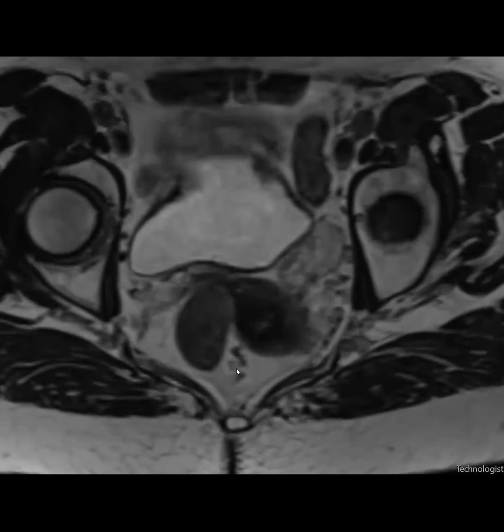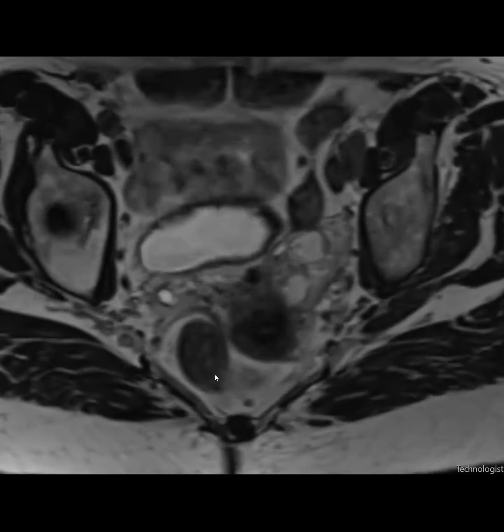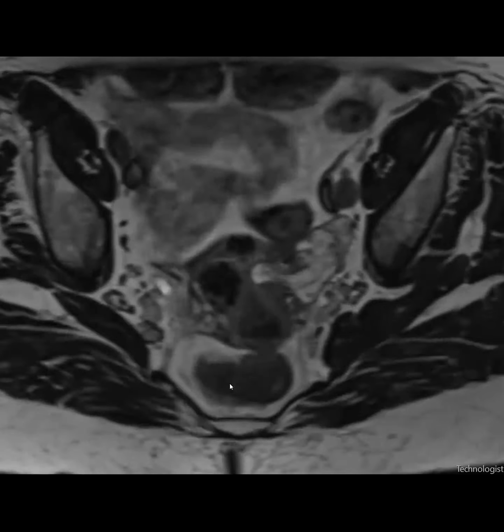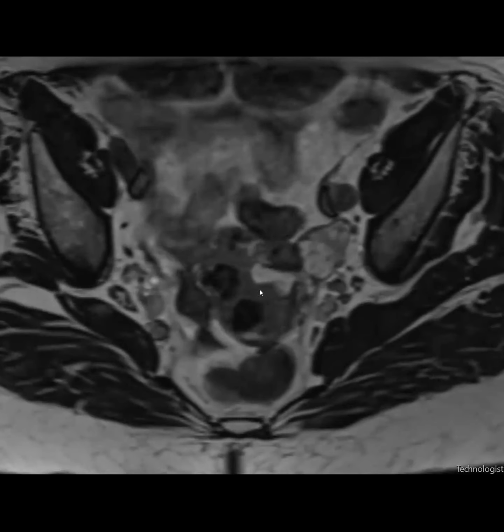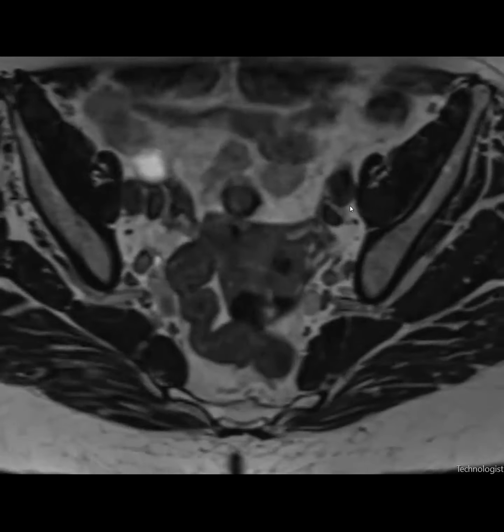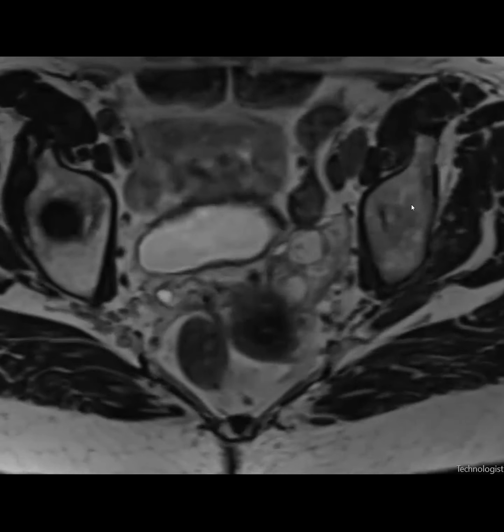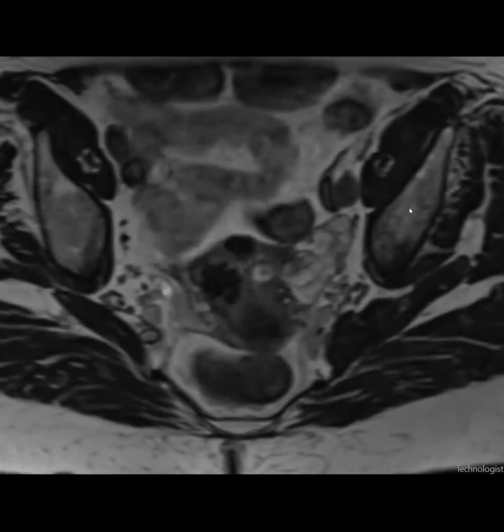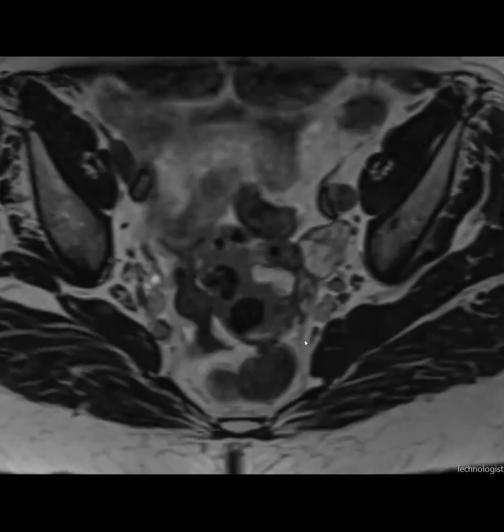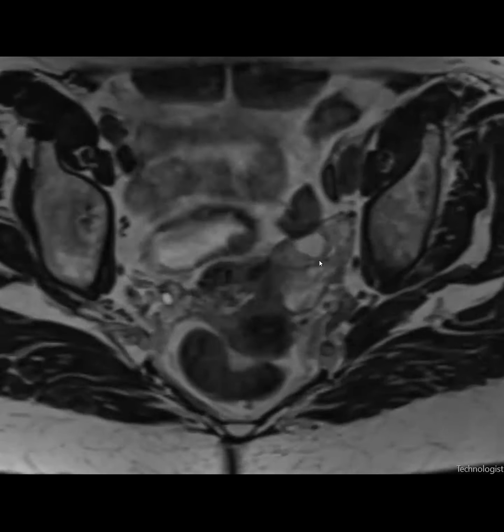Like it's so dirty. Like it's complex internally. That's true. We have not seen a liposarcoma arising from the actual uterus. Also, I think Aarti, in this case, the ultrasound helps to show that it's actually connected to the myometrium, right? Yeah. And both the MRI and the ultrasound, we felt confident that it was really arising from the myometrium. So we called this a lipoleiomyoma that had an exophytic part.